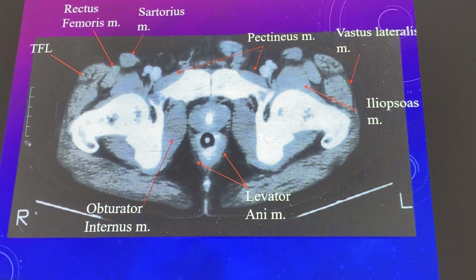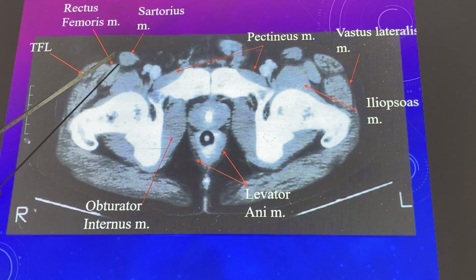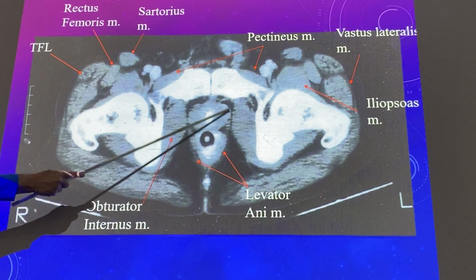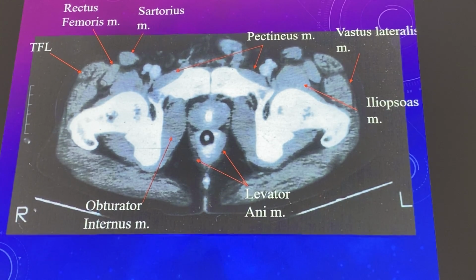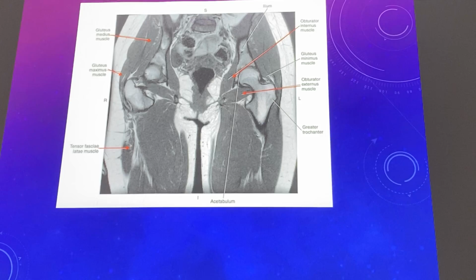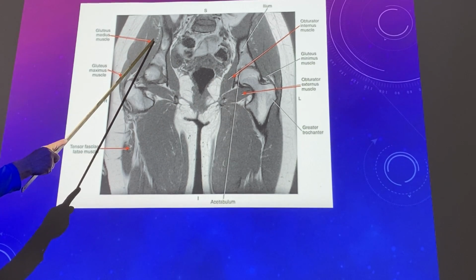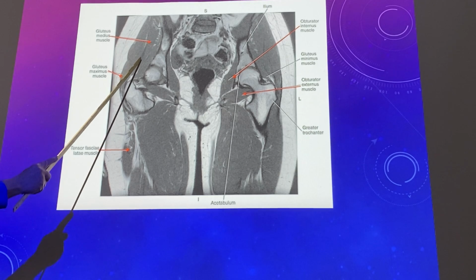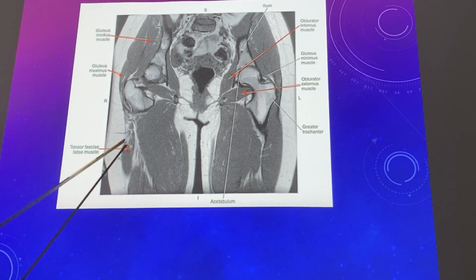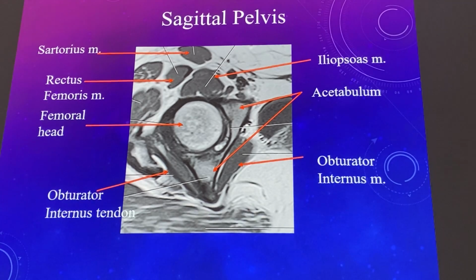A lot of anatomy, I realize, but these structures are kind of important. And the only way to really break them down is anterior, posterior, what you find medial in terms of the true pelvis. Because that really adds to a lot of your knowledge from that standpoint. Here is a different coronal perspective. Once again, obturator externus is coming off from that direction. Internus like this. We won't worry about this image, but you have the gluteus medius. Maximus is going to be out here, and your TFL will be what? We won't worry about that one. There's a lot to throw at you.